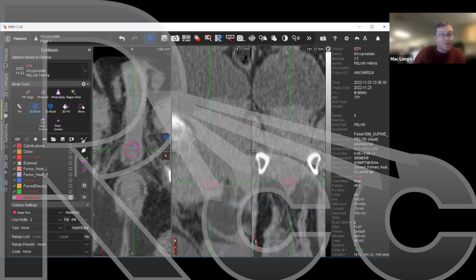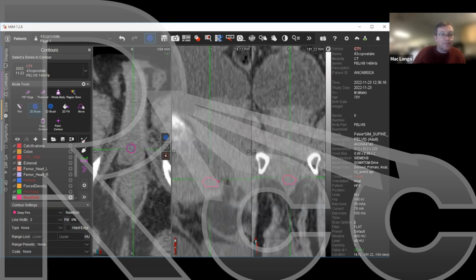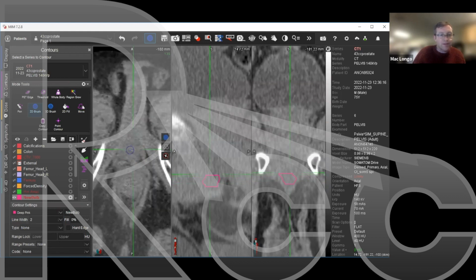Without a urethrogram or an MRI scan, it's really hard to see the urethra. But that can be one common contouring mistake, is that we contour the penile bulb too anteriorly. Now it's interesting, the correlation between penile bulb dose and erectile dysfunction is not well characterized, and some people think that it's really just a surrogate for the vasculature and the nerves that are critical to obtaining an erection. I might call the superior most border here.